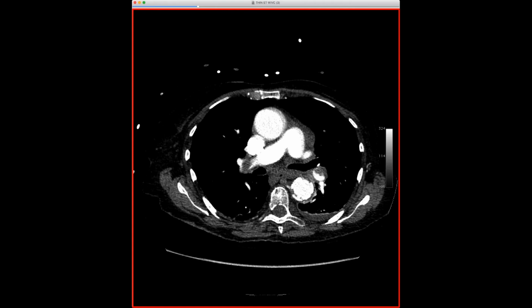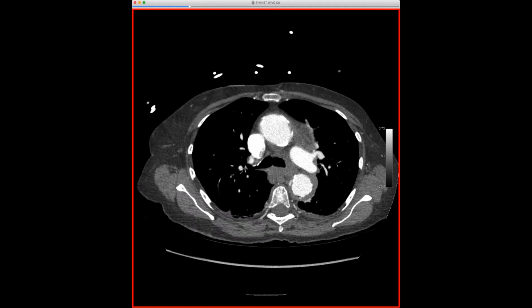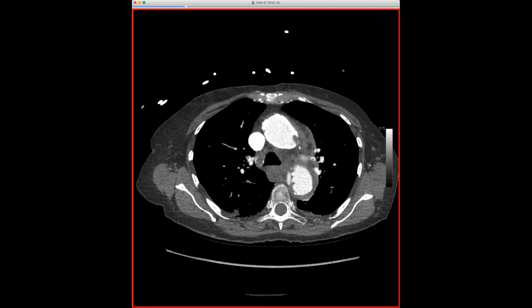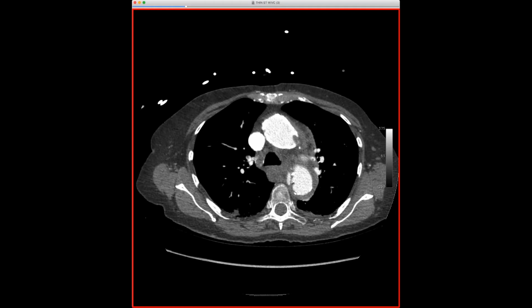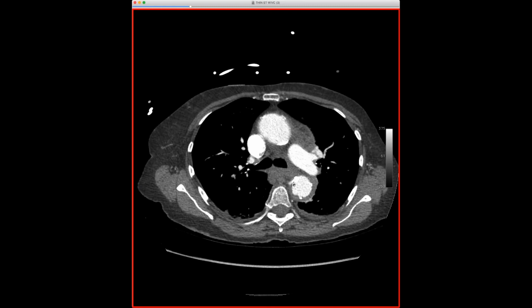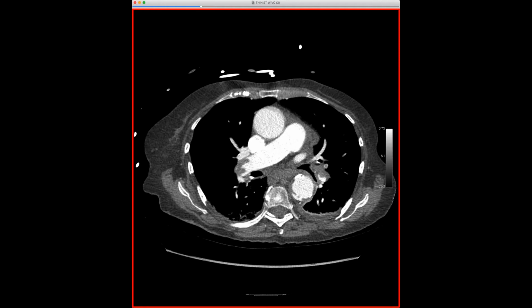Oh, that is interesting. Yeah, I've just not seen one. So I guess we've seen dissection flaps, we've seen intramural hematomas, but I've not seen one with this extensive atherosclerosis where probably this falls in that penetrating atherosclerotic ulcer spectrum, where that's probably where the entry is. And whether there's more entry or if it's fenestrated or what, I don't really know.